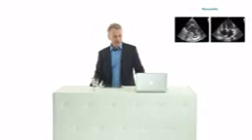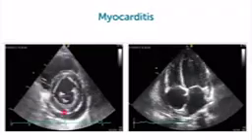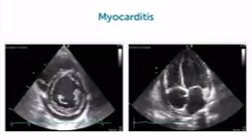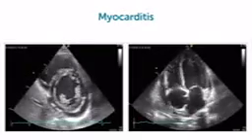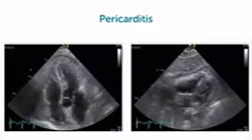Things might look a little bit different in this patient here with myocarditis. Why? Because, first of all, this pericardial effusion together with the reduced left ventricular function points to the diagnosis of myocarditis, so it can be used in a diagnostic sense. But it certainly does not need any form of relief. We do not need to perform a pericardial tap here. It's again just a finding which is complementary to the disease of myocarditis, or infection of the heart. So nothing to worry about, but an important finding in the sense of helping us with the diagnosis.